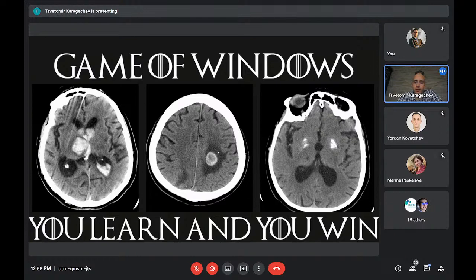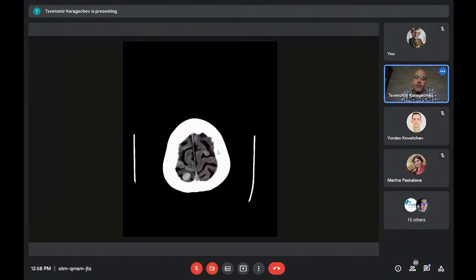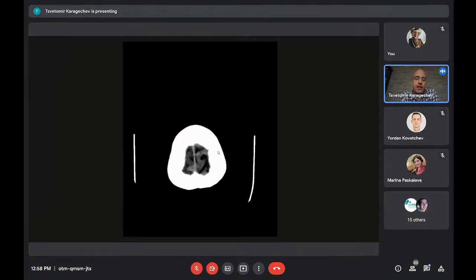And that was our game of windows. I'm sure that you can already handle this. So I'll show you another case. Again, there is not a lot of clinical information, I'll just show the case to prove the point that we made in the last few slides.